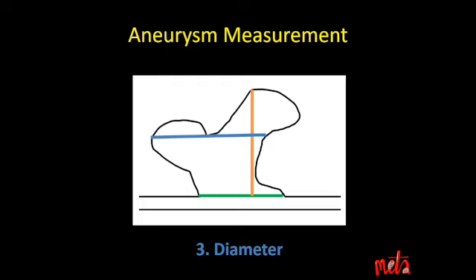You may be tempted to manipulate the aneurysm height or diameter to get a longer measurement, but it's important that it is purely the measurement that is perpendicular to the neck and perpendicular to the height respectively.